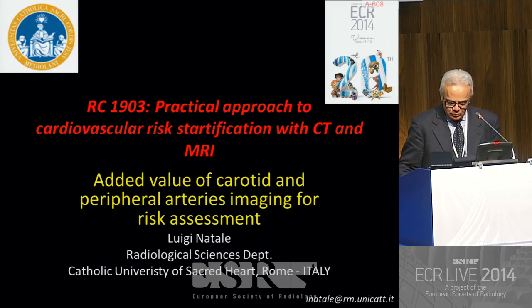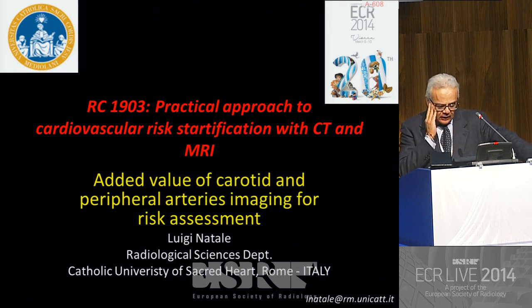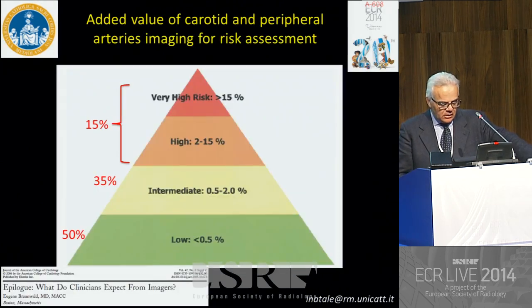So let's move out from the coronary arteries and go to other vessels. And let's see if imaging of these other vessels can help us in a further risk assessment.